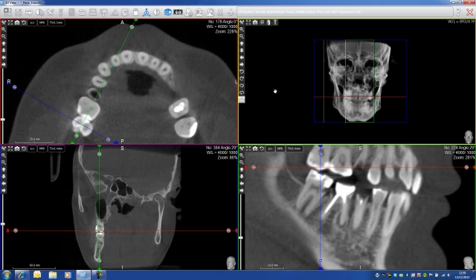And let's say if I want to measure one tooth here, I will come here again, take the first point, the second point, and here we go. My tooth here is about 17.3 millimeters. Now, the good thing about these tools is the fact that we can measure precisely the density of the bone.